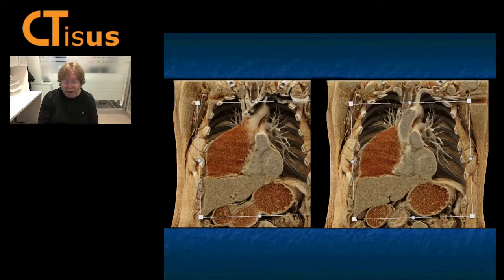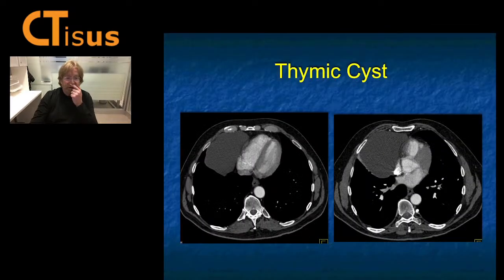But what about a thymic cyst? We talk about lots of thymic lesions, and we always think about thymomas, but there are thymic cysts. Yes, they're usually small, in the 3 centimeter or so range. They're usually eccentric, which this is, but not this large coming down to the diaphragm. And guess what? This was a thymic cyst. What a great case. Let me give you another chance.